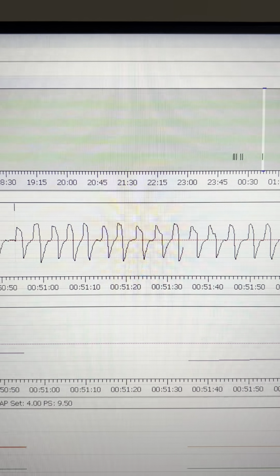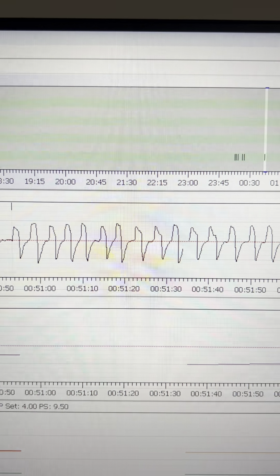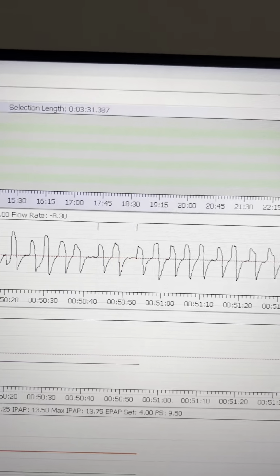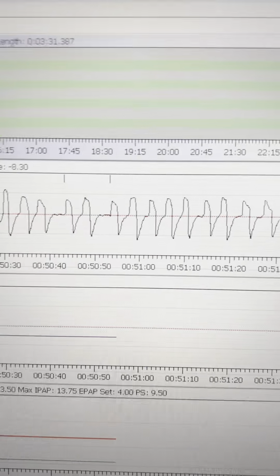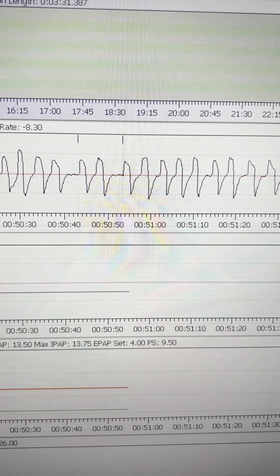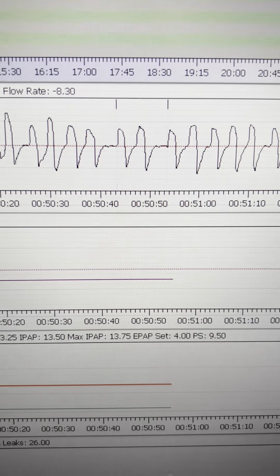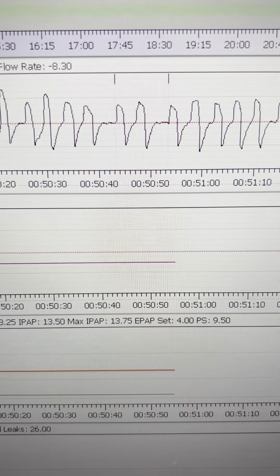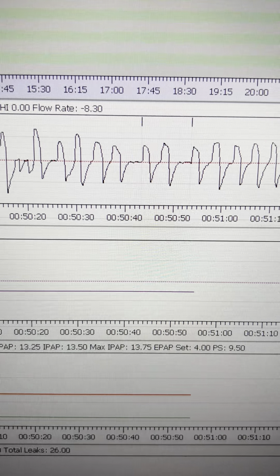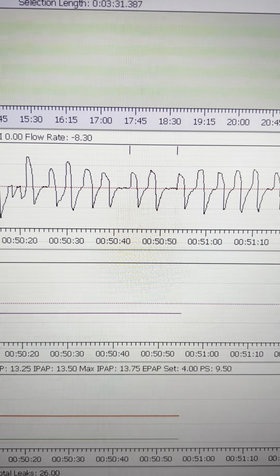So one is like tired energy, and then the other one is actually sleepy. Like I feel like I'm gonna fall asleep constantly. So that's something that you will want to balance, I guess, here. And the more PS you get, the more EPAP you will probably need, because it's just not normal to have that much PS, because it ventilates you a lot.